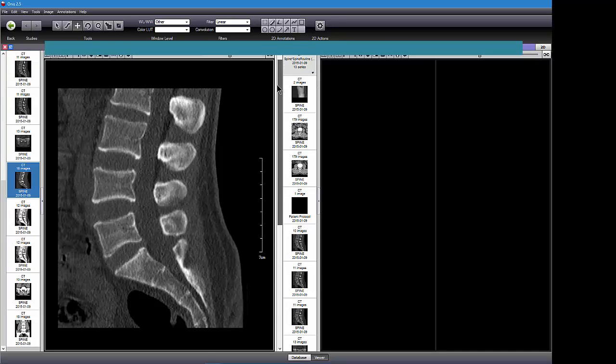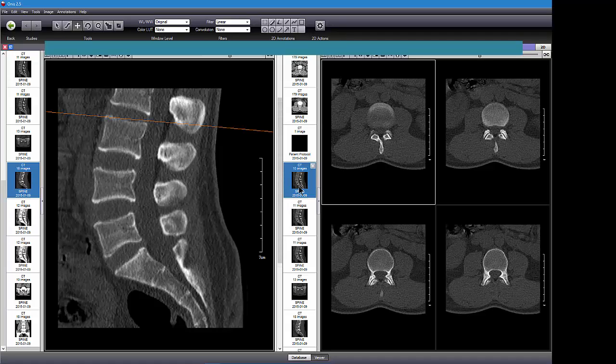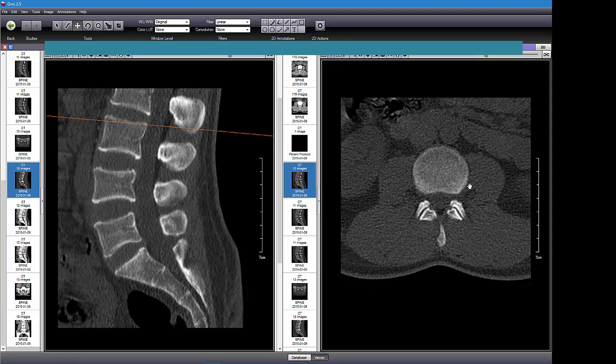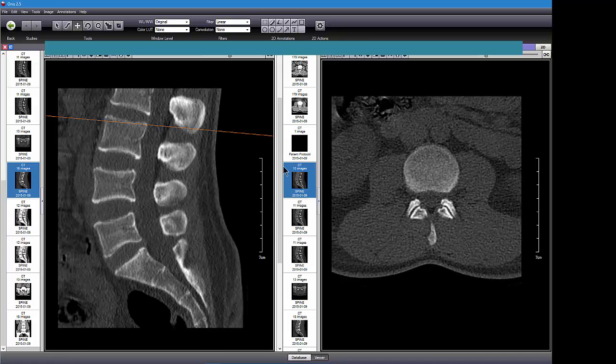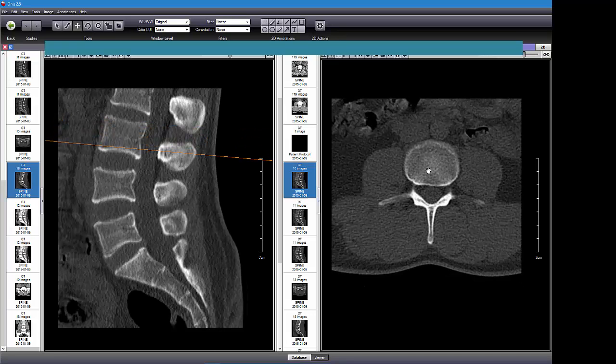There's a whole bunch of different images. And don't be frustrated because sometimes the pictures here don't match up with really what the images are. See how that says it's a sagittal view? It's really not a sagittal view. It's an axial view. 4 views, get rid of that by double clicking. And the minute that comes up, we have a nice long cut line that pops up. So whatever this cut line goes through is the view from overhead on this side. Okay, so if I left click over here and I can march down, it's only 10 images, so it's just a section.